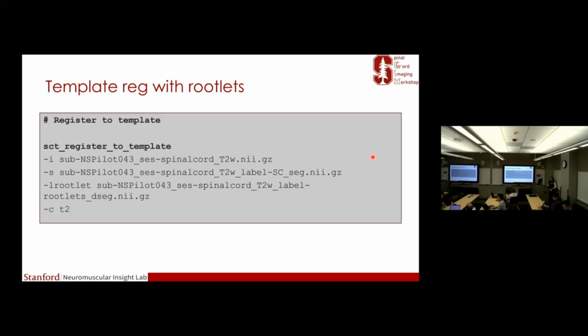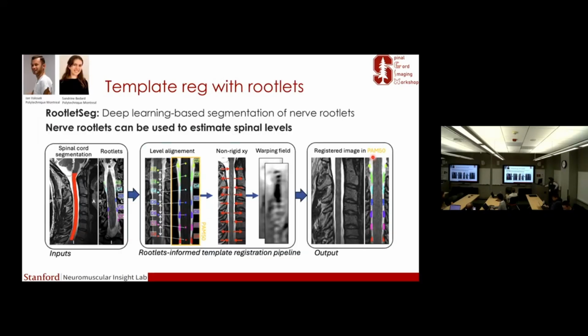Can I? Yes, of course. So on the right, there are these gaps between the rootlets, the different levels. So if you see an activity right there in between two, how do you label those levels? Well, I think that's a question we're also wondering, in the sense that the rootlets we cannot see exactly.